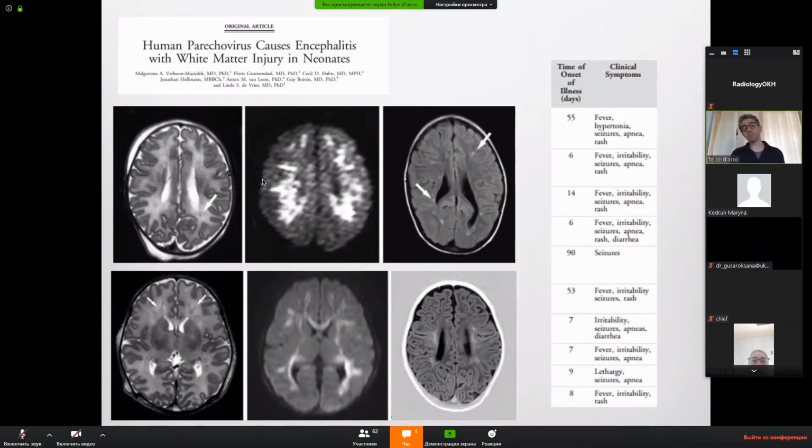And then it's important because over time you have PVL, periventricular leukomalacia. So PVL is not only something that you can have in prenatal, in preterm, sorry, neonates, but is just a descriptive term of a leukomalacia involving the white matter around the ventricle. So remember this pattern for parechovirus, very, very important. This is a paper that you can download.